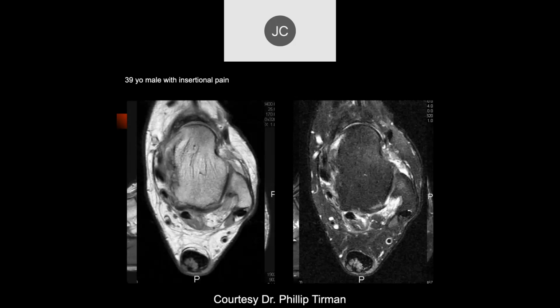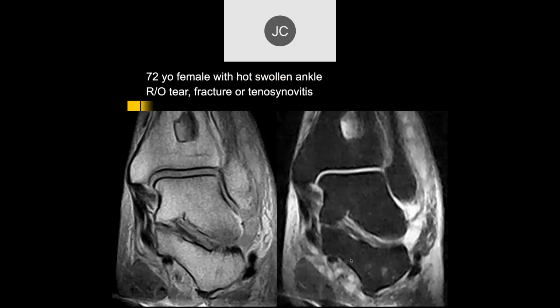Most inflammatory conditions have very indistinct margins. Gout tends to be very sharply defined, which we see there, and that's what it looks like within the tendon, which is not an uncommon finding. Most of these are treated by rheumatologists, and orthopods don't get involved unless a tear occurs or dislocation.